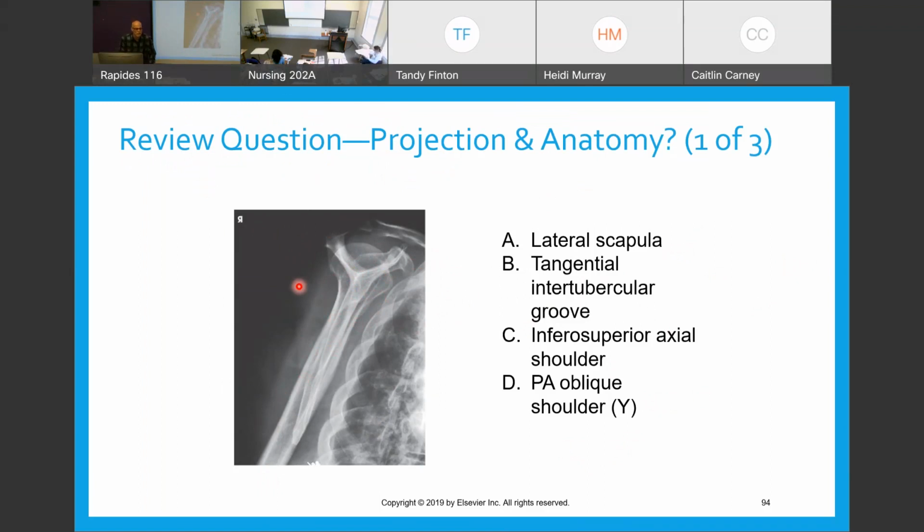So we know this is a scapula Y for glenoid cavity. Scapula Y for shoulder joint dislocation because the what? Relationship of the humerus and the glenoid cavity doesn't change. So the placement of the arm is irrelevant. If this was a lateral scapula, it would fail.